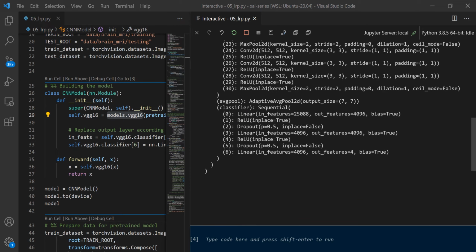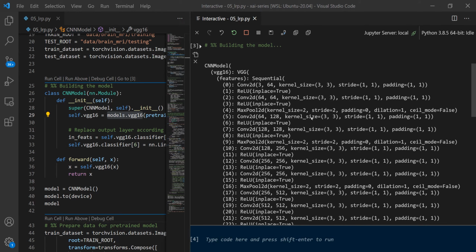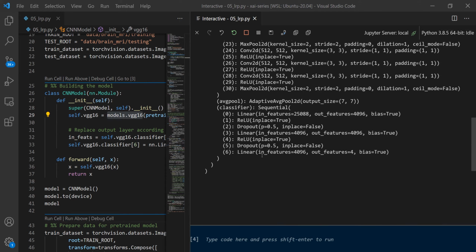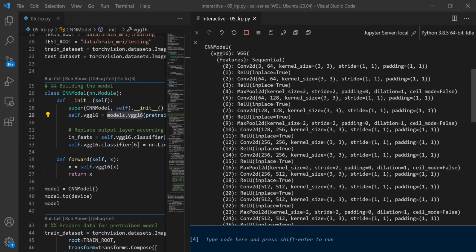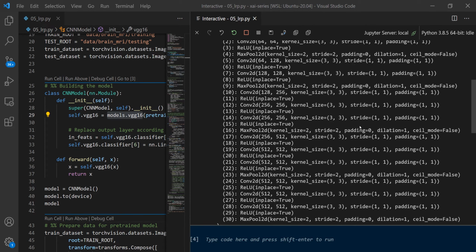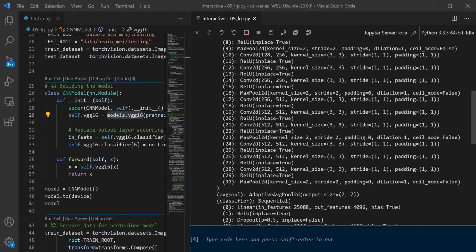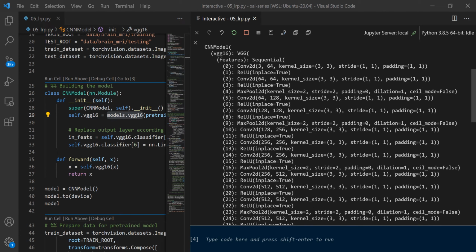One thing I want to point out here is that layer-wise relevance propagation can be quite tedious if you have more complex architectures. Here, as you can see, it's pretty simple. It's just a sequential set of layers. If you have more complex things like ResNets, where you have splits, like different branches of layers, propagating that will not be so easy as we do it in this example, because here we just can iterate over the layers and don't have to care about branches or forks in our network.